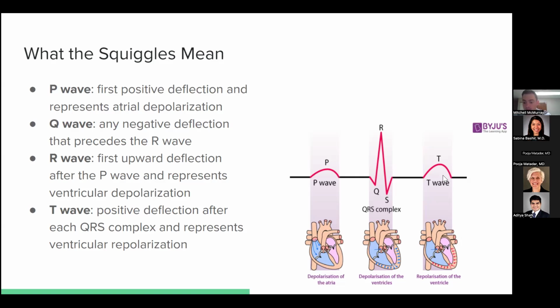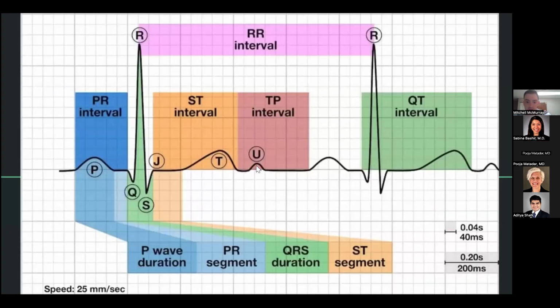after the QRS complexes. Sometimes T waves can be inverted, and that can be normal, especially in lead aVR, which we'll see in upcoming EKGs. But normally they're supposed to be upright. And then sometimes you can have a U wave over here too. I didn't mention this in the last slide. This is frequently seen in patients with low potassium, hypokalemia. It's just an extra hump there.